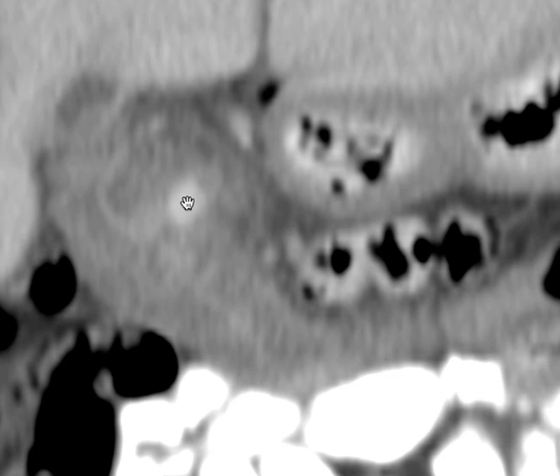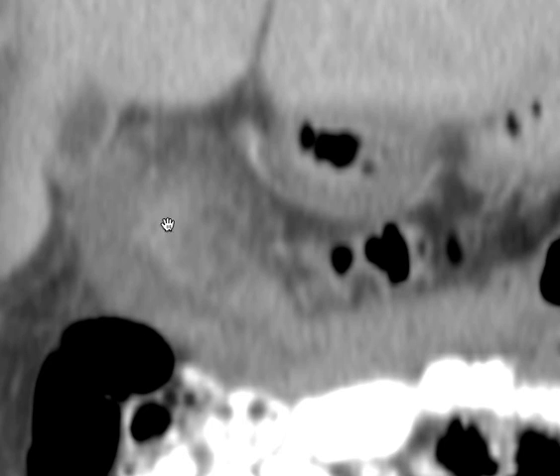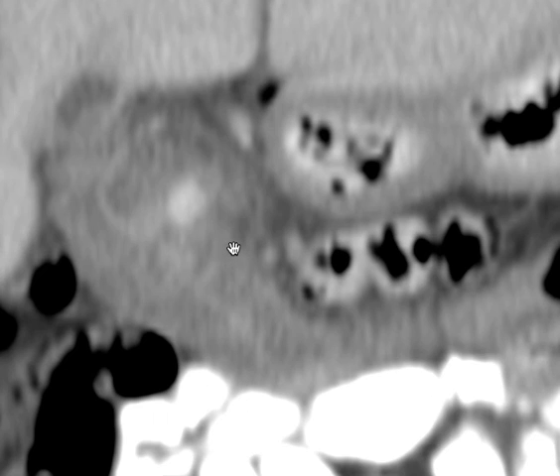So that's why you get mucosal edema involving a long segment of proximal transverse colon with pericolonic stranding adjacent to this small collection of oral contrast, which appears to be in or slightly outside the confines of the colon.